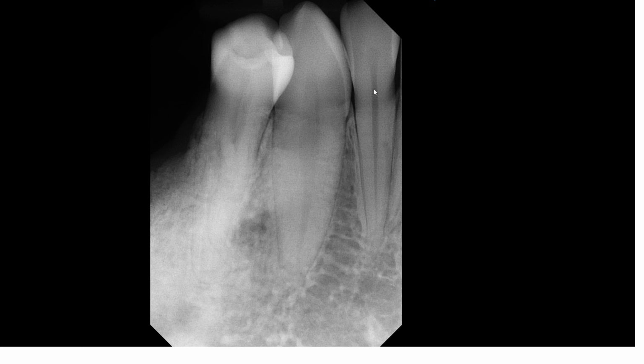roots and such. In this case, as we expect, it looks nice and linear, straight, with no significant bending of the root, and even the pulpal chamber and the canal is relatively linear and straight with no significant calcification. So that's what we want to see. And as expected, number 27, we see similar findings. Nice and smooth root outline of the canine, and the pulpal chamber and the pulpal canal is visualized. As far as we can tell, that's pretty straight.